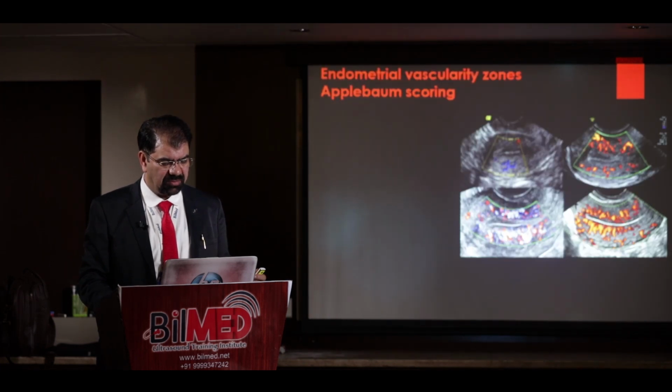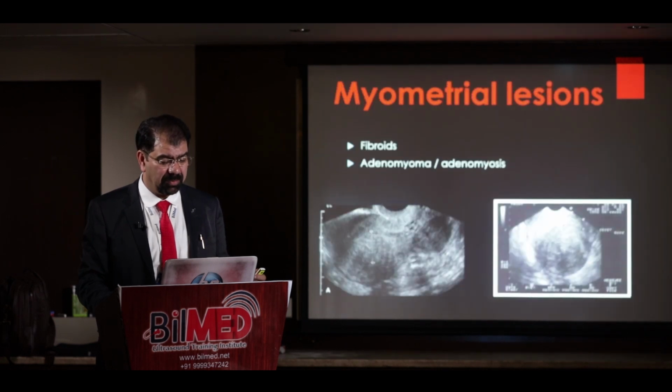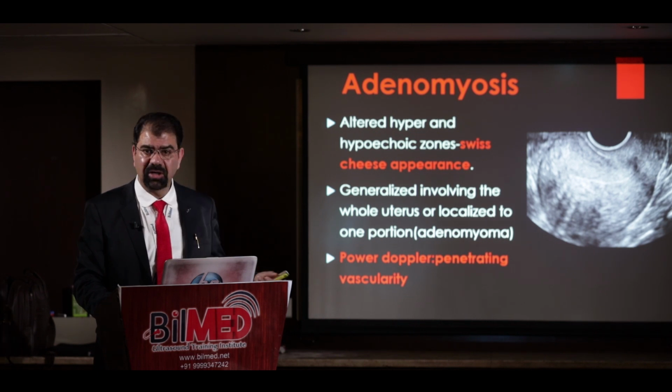These are all the things which I have to see, these polyps over there. So that is why I am skipping between the slides. I have to see for any adenomyosis. This is all covered in the previous session.